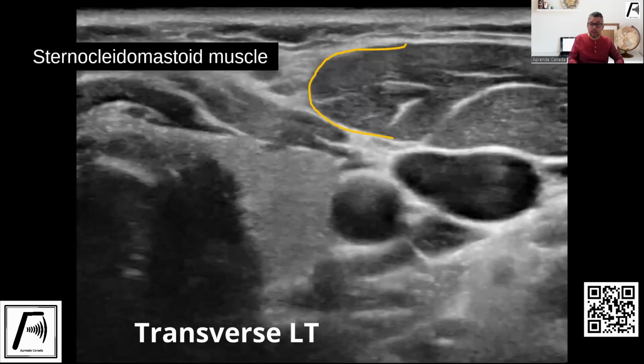And so nowadays also with things like compound imaging, usually these shadows from the refraction do not affect the image as much as it used to in the past. However, depending on the machine you're using, depending on whether you have compound imaging on, and most times nowadays, it's on by default. But if you accidentally turn it off or your preset doesn't have it on automatically, it's a good idea to be aware of it and how to get rid of it.